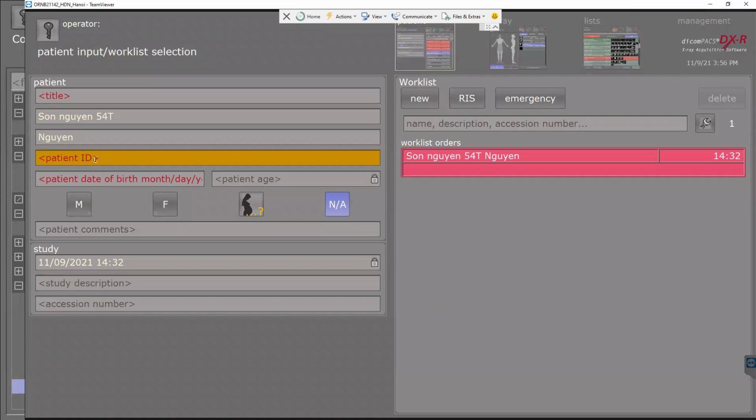I know I can add a patient ID normally, but I want the patient ID to generate automatically. But no, that's not possible. Oh, you can try the support mode.